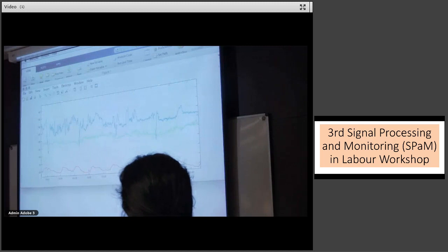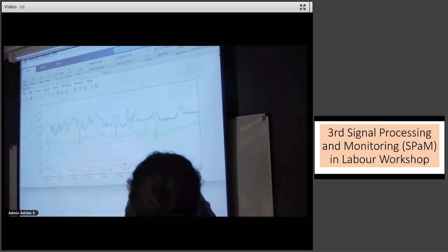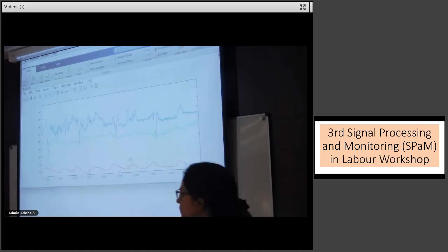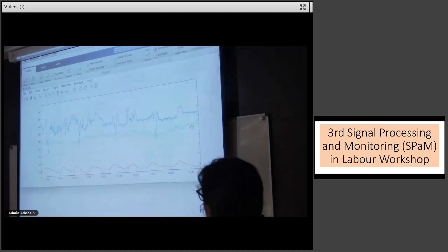Too many contractions. Every 3 minutes, remember? 3 minutes, 3 minutes. It's two to three contractions in 10 minutes. So 2 to 3 in 10 minutes is really okay. It's the scale that gets us sometimes, that's why I keep on saying. I was just looking at the descent.